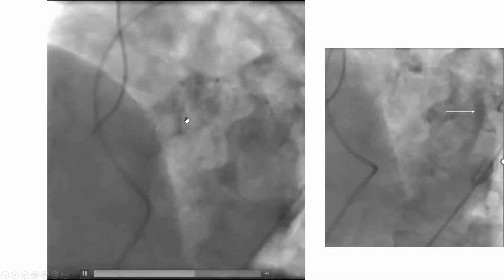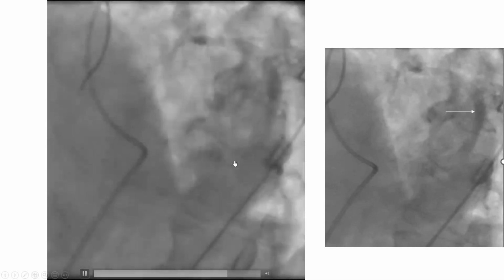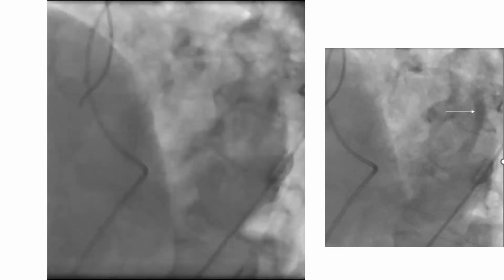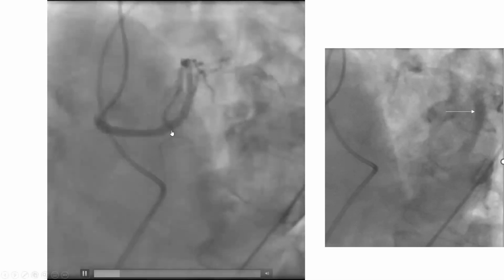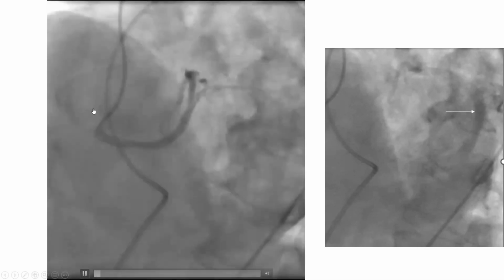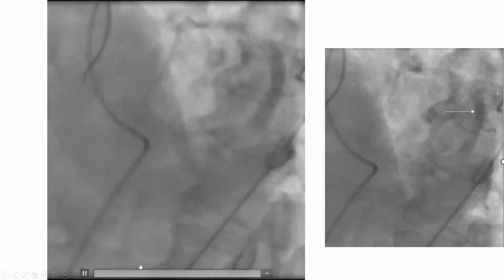So I don't need to go fish for another artery here, okay? So remember that: venous phase, coronary sinus, left circumflex, okay? So we define, this is an anomalous left main. This is actually a long left main that goes retroaortic and gives an LAD and a left circumflex.